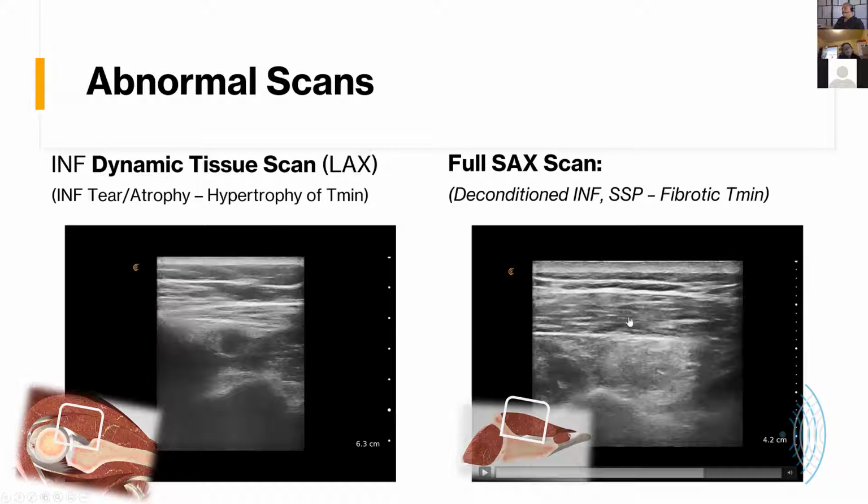The unique thing as well is that above this is the deltoid muscle, and the deltoid muscle itself is also axillary. So as a diagnostician myself, looking at this, I'm asking why is it that the teres minor is atrophied and fatty infiltrated, but the deltoid is not? The answer is that the deltoid is from the superior fibers of the axillary nerve.